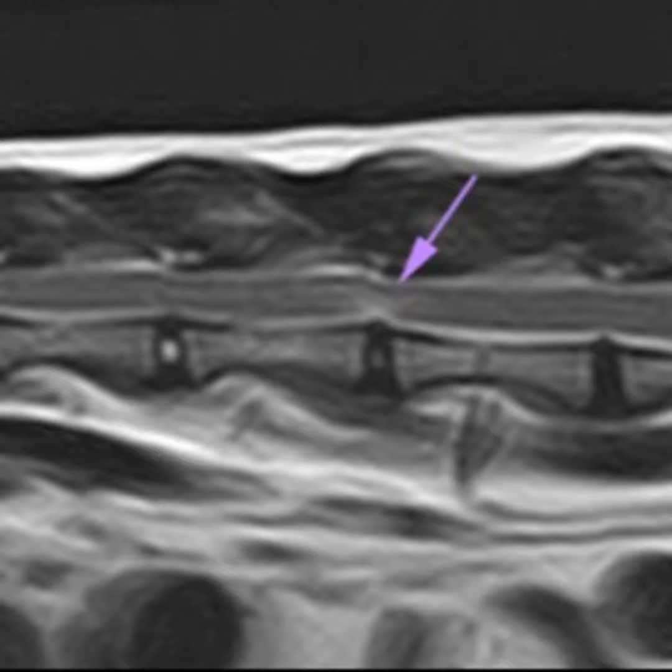The first intervertebral disc herniation in cats dates back to 1971, and since then several clinical cases have been published, mainly as case reports or case series. And as you can see from this chart, an essential contribution to the knowledge of this condition comes from the last 6 years, with these 3 larger retrospective studies. The 2 on the left describe intervertebral disc herniation limited to the thoracolumbar spine region, and the other one focuses on a single type of disc herniation, the acute non-compressive nucleus pulposus extrusion.